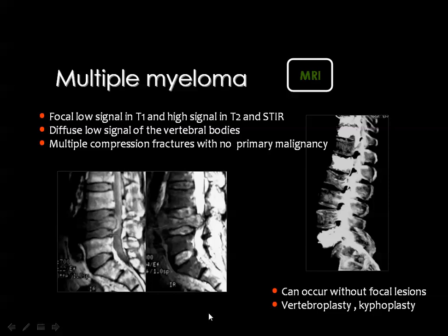This is considered one of the stigmata of myeloma, as stated by some of the literature. Whenever you see that the vertebra is collapsed and the posterior border of the vertebra is encroaching on the spinal canal, and typically this border is convex, then if you see this appearance, this is not actually pathognomonic for myeloma, but it represents a malignant disease. You may suspect myeloma from this appearance, but the final decision will be left for the biopsy.